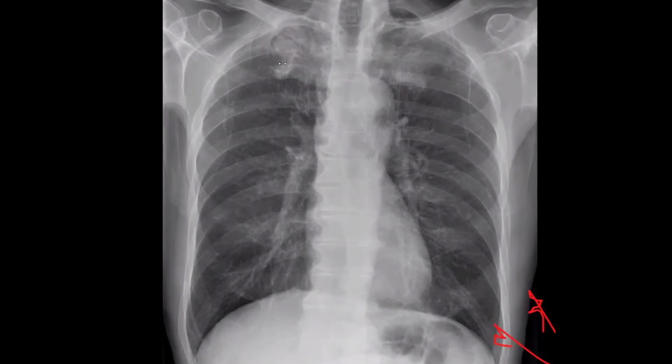And as we said, mycetoma can develop on top of old tuberculosis infection, sarcoidosis, or something like this, in the upper lung zones. And we have a classic mycetoma appearance, fungus ball within the cavitary region. Okay.